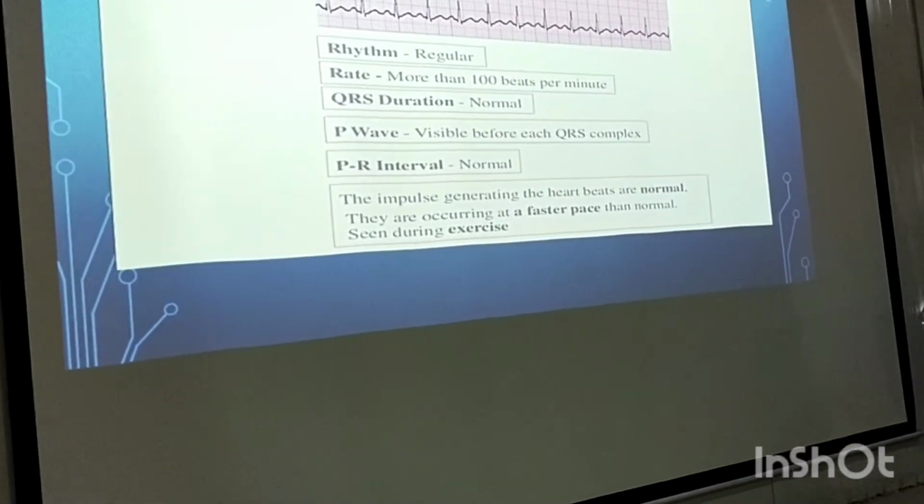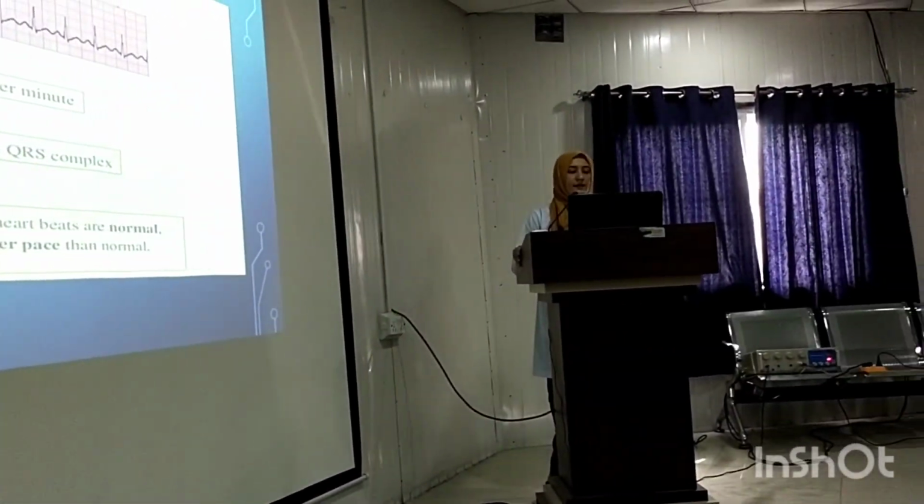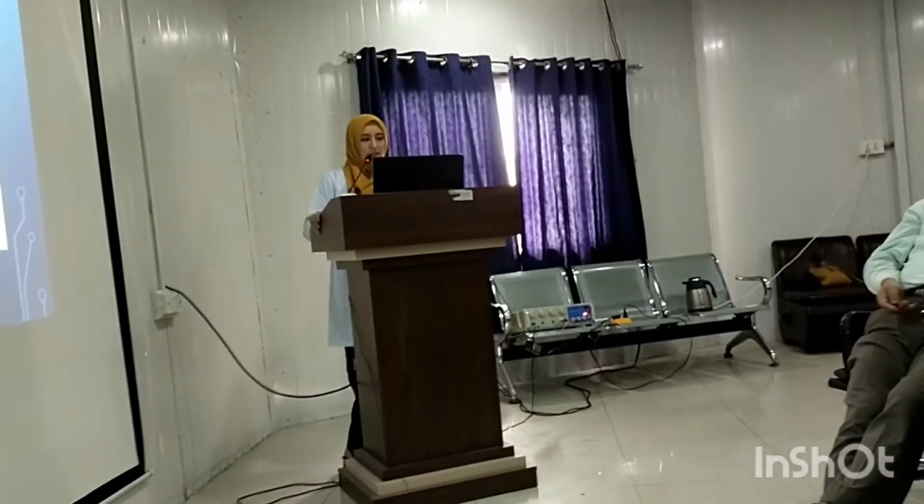Okay, so now sinus tachycardia. Whenever the heart rate gets more than 100, it's sinus tachycardia. And why do we say it's a tachycardia? Because the heart rate is more than 100. Now, can anybody just calculate the heart rate for me? Yes, it's a good effort.